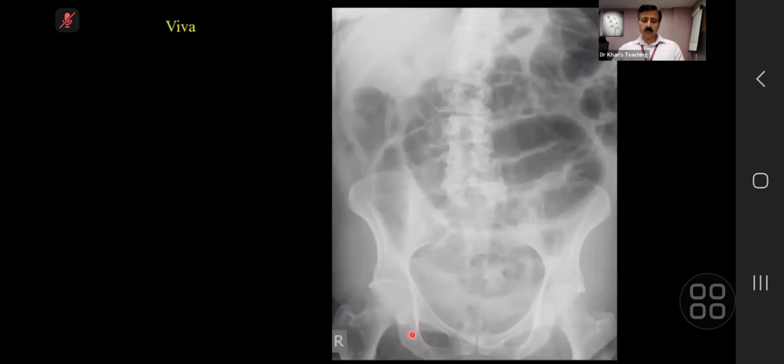7, are you with us? Can you raise your hand? So, can you hear us? Yes. So, in this case, there is ischemic bowel. Because of time factor, I want to crack on. You tell us the findings.